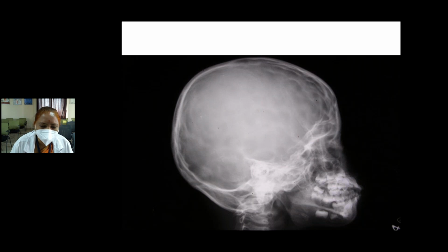So this X-ray is also commonly given in your orals, in general medicine and also pediatrics. It's a very clearly taken X-ray. Findings are very clear. Plain X-ray lateral view of head showing the skull and the facial bones.